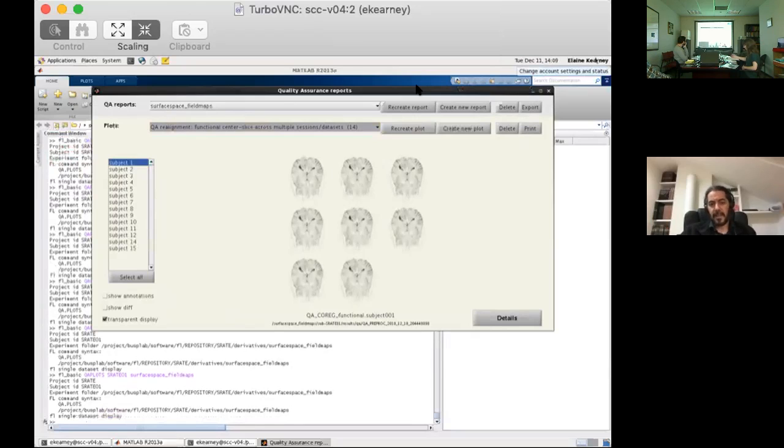That means this is just showing one particular slice, the middle slice of the entire acquisition, and that could be really oblique or kind of strange looking. So this kind of quality assurance plot is not so much to identify what exactly you are looking at, but just to identify if there are any differences at all across time. No matter what you're looking at, if it's relatively representative, it shouldn't show any type of residual motion effects, and it should look identical, even though in this case it might be slightly inconvenient to have something that is slightly oblique and not very easily characterizable.